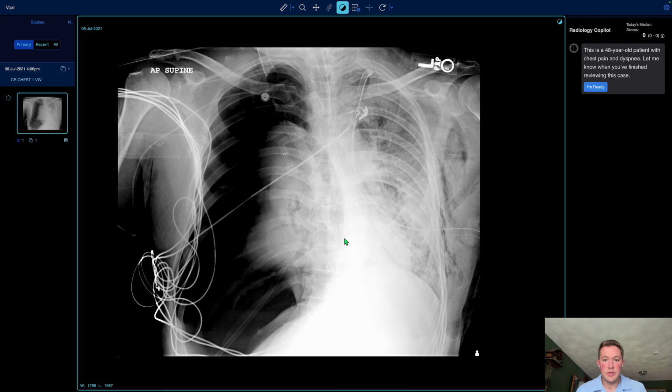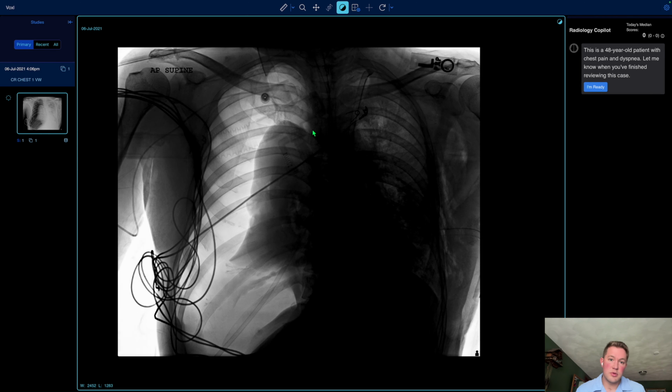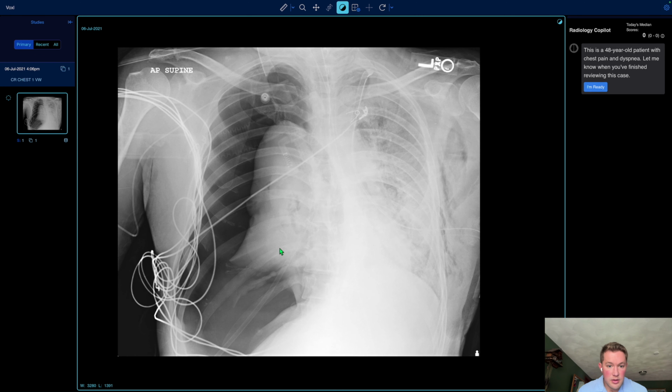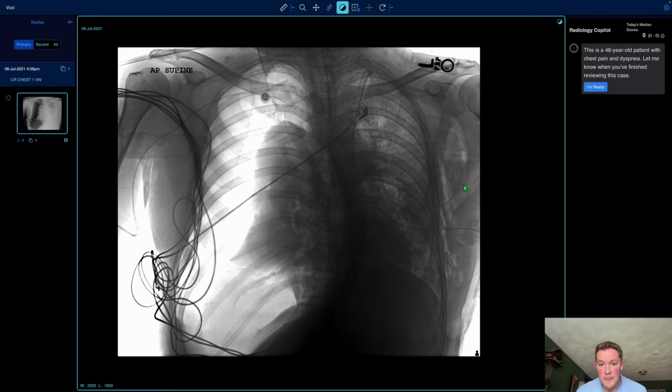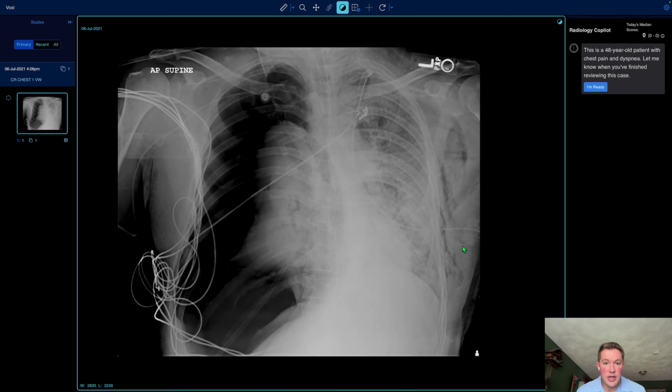Moving into B, bones, with some aggressive windowing and leveling, we'll take a look at each one of the ribs first, from posterior to anterior, all the way around, tracing to see if we have any kinds of fractures, just one at a time. I'm not seeing any fractures for the ribs on the right chest wall. Moving my way through the left chest wall, I'm not seeing any displaced or non-displaced rib fractures there.